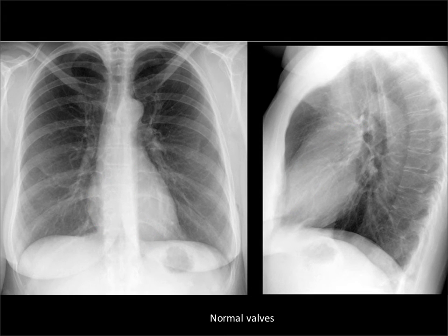Alright, now let's look at the mitral valve. So our left atrium is sitting behind here, but we've got our left ventricle here, so we've got to join those two up. Got our left atrium here, we've got our left ventricle here, so we're going to put our valve right about in there. It's got to flow between the two. And if you think about the orientation of that valve, the blood's flowing this way, so it's going to be on edge from this projection, but it's coming out towards us from the back to the front of the heart on the frontal, so therefore it's going to look more like a circle.